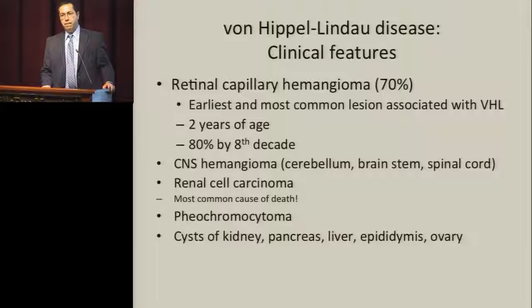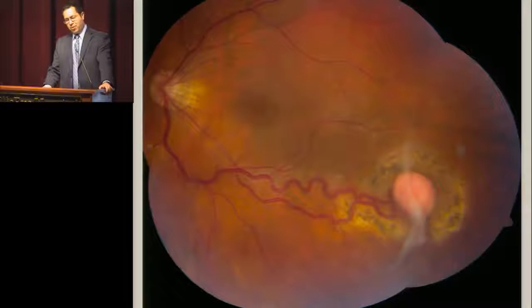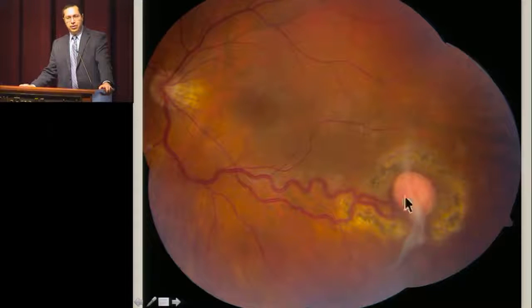So the laser in that? You know what? Actually, that's a good question. This is not really how I treat these tumors, not just around it. You have to treat the tumor itself or treat the feeder vessels to make the tumor shrink. This tumor, as you can see, was treated around with laser. The exudation went away. The tumor didn't go away. So many years later, this patient came back and it was larger. So we had to treat it with a different technique later.